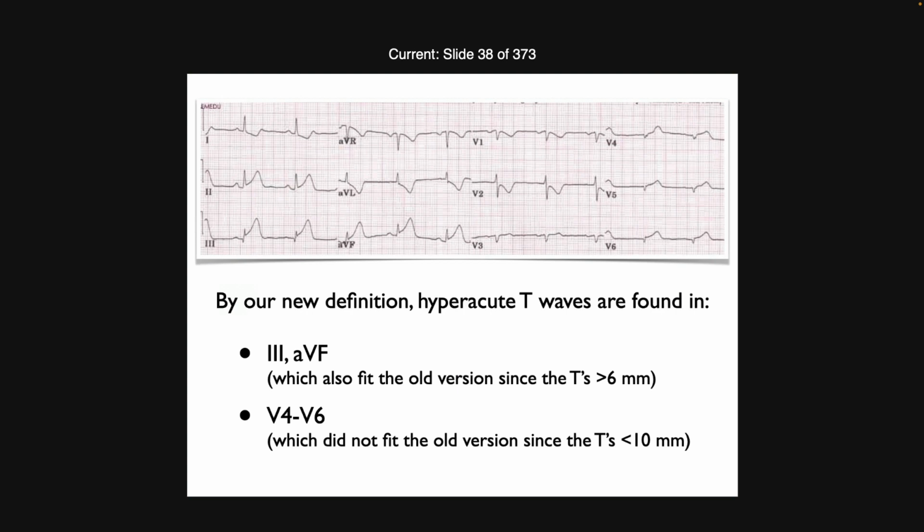Where else? Where else do you see little tiny QRS complexes relative to the size of the T wave? Even if the T wave isn't giant. Yeah. See how small this QRS is? You could take that and stick it in, the amplitude is less than the amplitude of the T wave. Same thing here, same thing here.